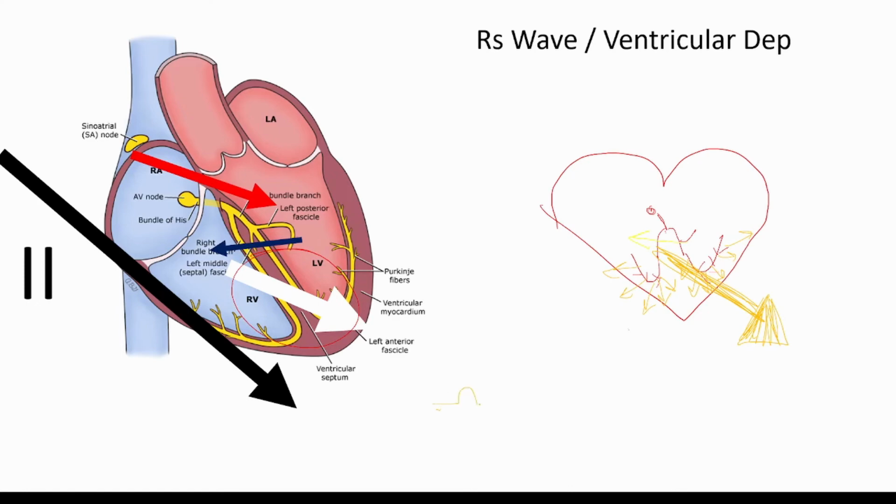And now in terms of the amplitude, why is our R wave so big? So here's our P wave, which we already mentioned is a positive deflection, a negative Q wave, which we have already mentioned, and then the R wave. Why is it so large? Well, it's so large because of the ventricle. We know that the ventricle is very big, and that's the reason why we have such a strong amplitude in our ECG. That is why we have this very large R wave.